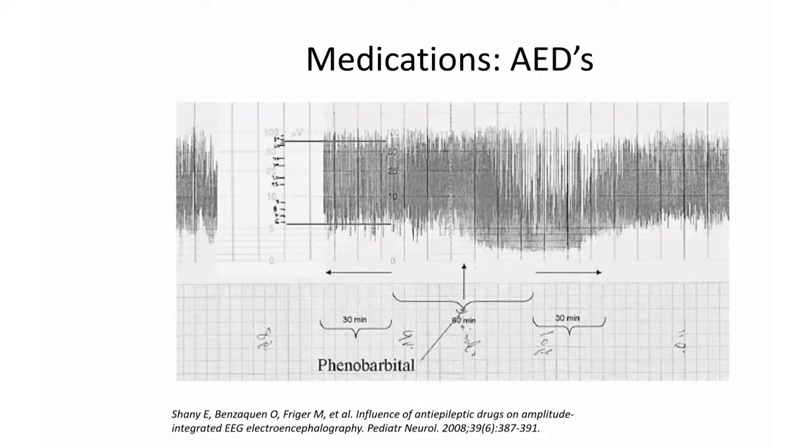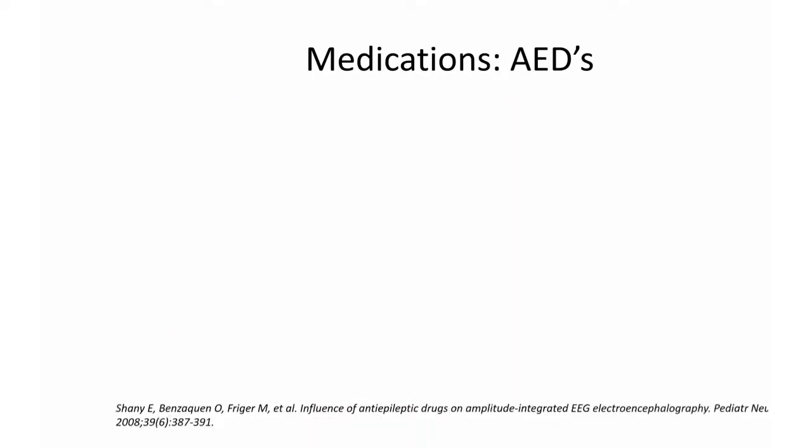What I've seen in practice is that the sicker the brain, the slower it recovers after an AED. This is, to me, a pretty healthy brain, not only because it was healthy before the dose, but then the quick recovery, 30, 45 minutes of a lull in activity as you're hitting that upper kind of maximum concentration and distribution in the body. And then the brain kind of is, okay, that's fine. We're at steady state now, I'm good. The sicker the brain, I find you give that loading dose and it never comes back up. So that's just my personal experience with that.